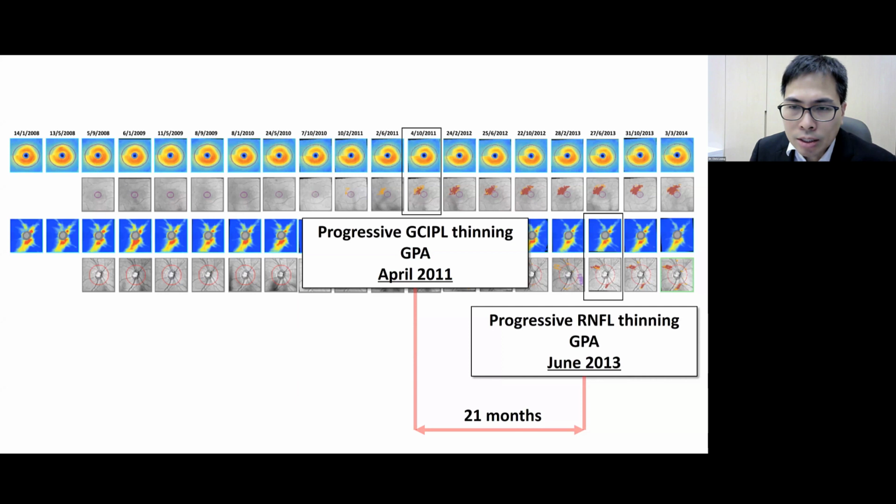As I mentioned, it is important to understand retinal nerve fiber defects. They are often wedge-shaped. And when these abnormalities progress over time, it would actually be easier to detect change of the macula. So it is not surprising to see change detected at the macula before we see change detected around the optic nerve head.